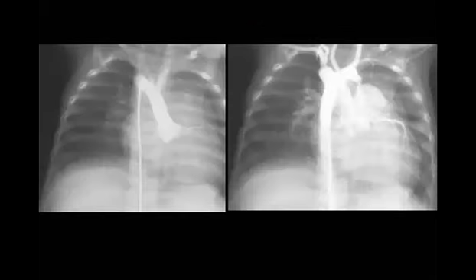Maybe this one is an easy one. After he injects the contrast, and you can see the aortic arch, then they will show you the vascular anomaly here, which compresses the trachea from both sides. Yeah. So it is probably like the double aortic arches.